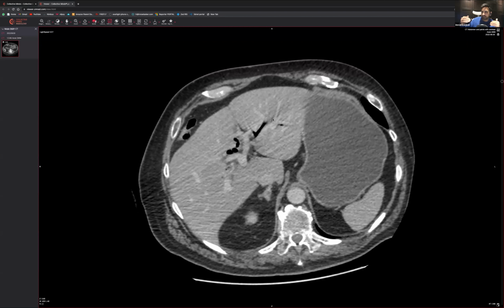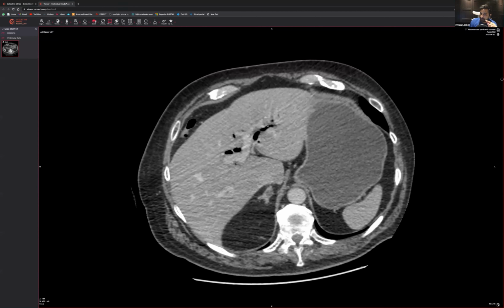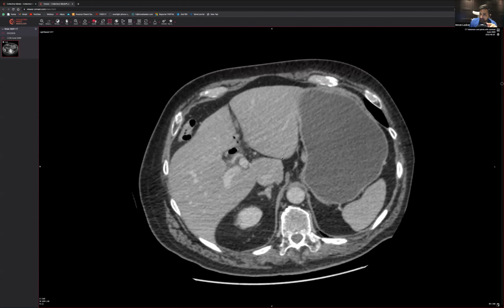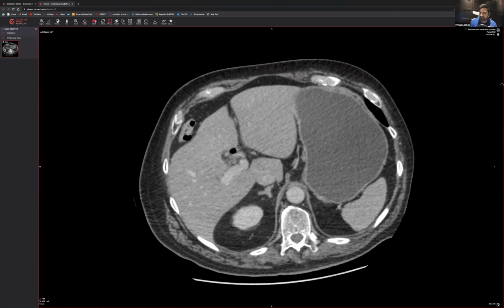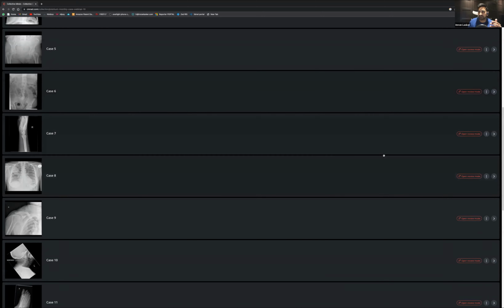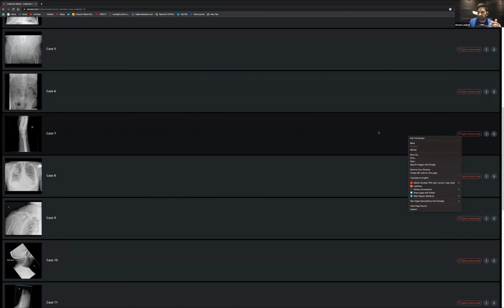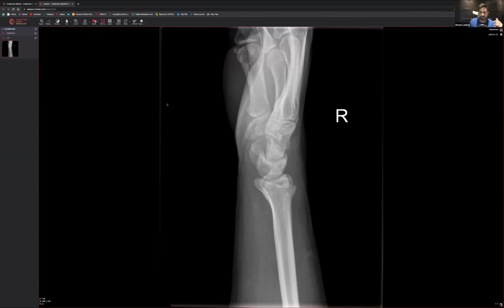When you come to the portal vein, blood has been pumped all the way to the edges. Now, instead of blood being pumped all the way to the edges, you're having air pumped all the way to the edges. That's why air would go all the way to the edges if it's portovenous gas, and that's worrying. But with the biliary system, the bile is going outwards, because you're trying to push bile out of your liver. So it's not going to the edges, it's going away from the edges and into the rest of the system. That's really important. There is a big difference, with real clinical implications, between calling biliary air versus portovenous air.